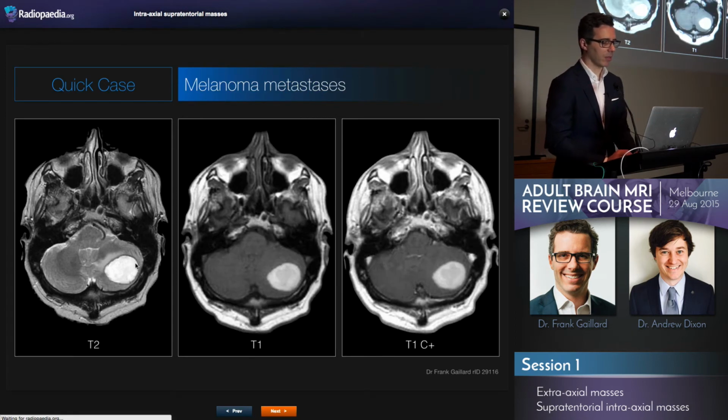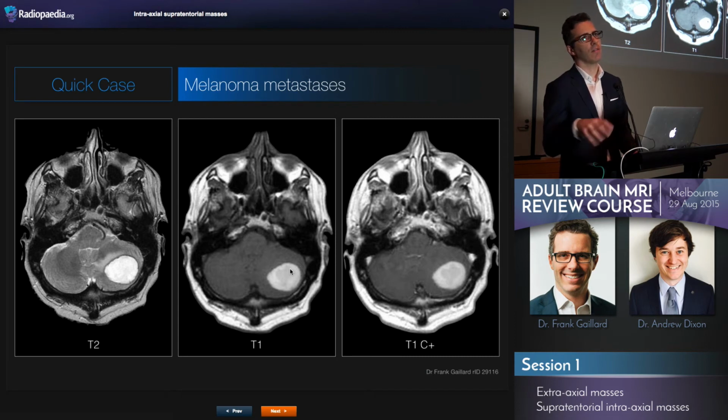And the same patient in the posterior fossa also had this very intrinsic high T1 signal lesion. So when you see that pattern, this is a very unusual pattern even for any one of these solitary lesions to be a high-grade glioma, and you can be almost certain that these represent metastatic hemorrhagic tumours.